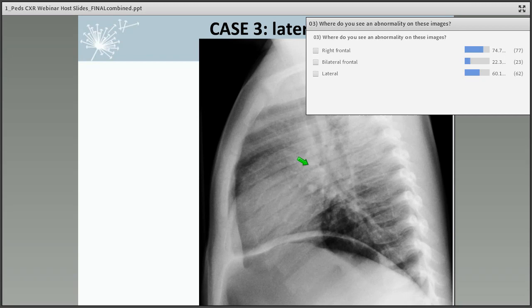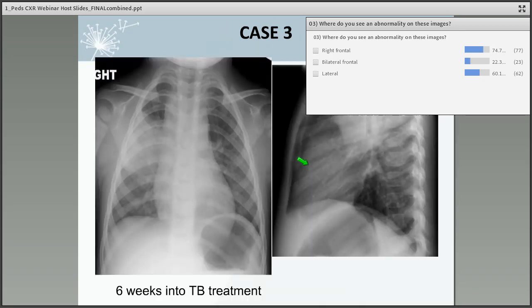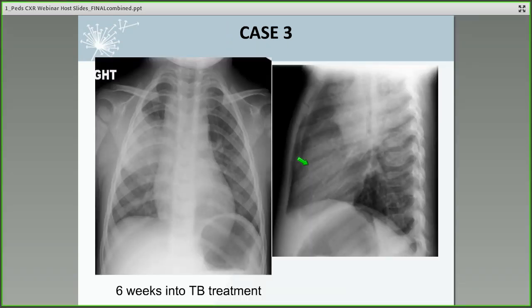And so as is my practice, I usually obtain repeat images at about 2 months into therapy. This one got filmed a little bit early, and I can't really remember exactly why. So at that point, she was tolerating her TB meds. She had a little bit of noisy breathing with exertion, but she was gaining weight. And the history that we got is that she really was getting every drop of drug by directly observed therapy with good doses, and Dad's isolate was pan-susceptible. So what are you seeing here, Dr. Wu?